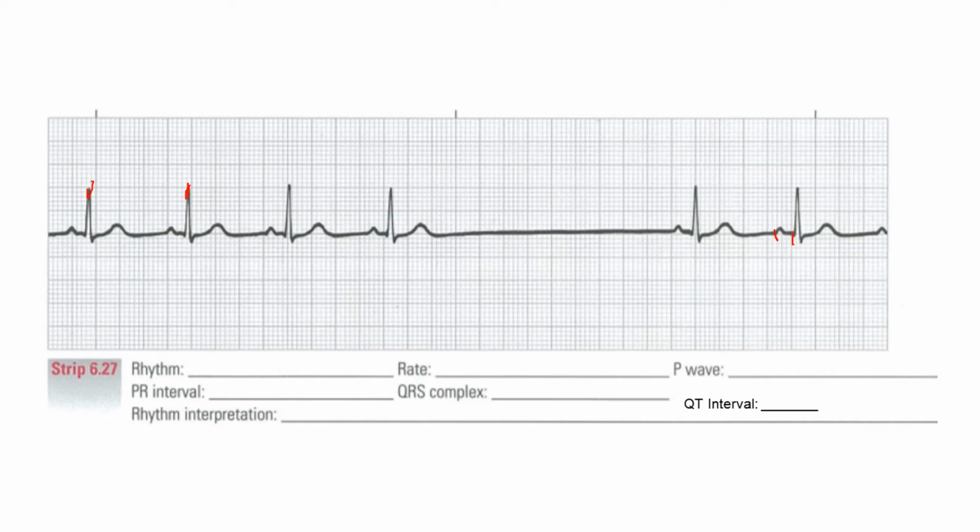Now let's look at our QRS. You're measuring again from the beginning of the QRS to where the S wave comes back up to the ST segment or the J point.